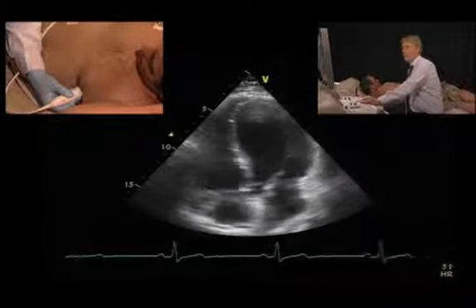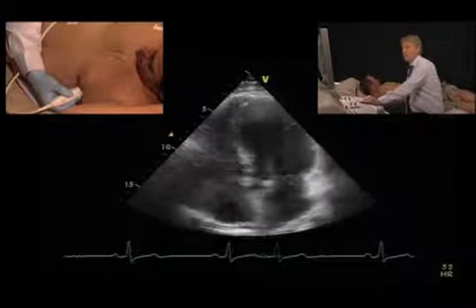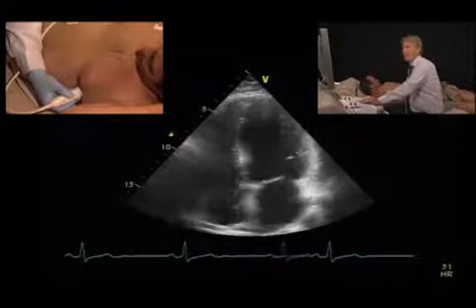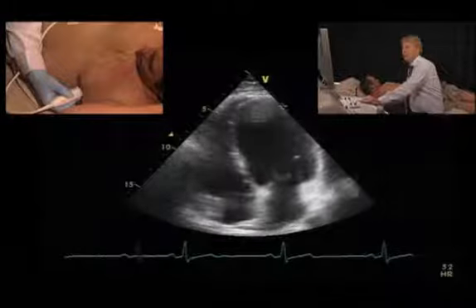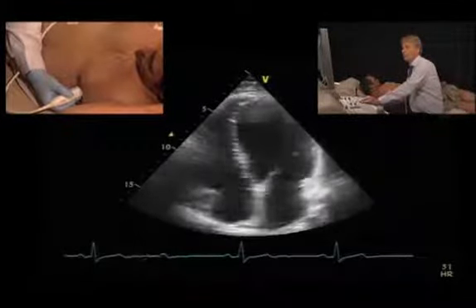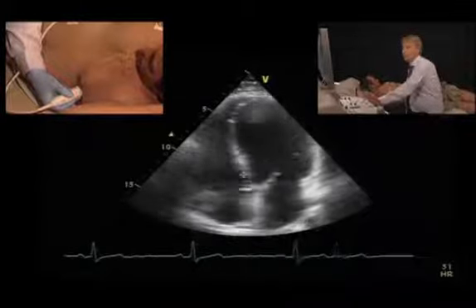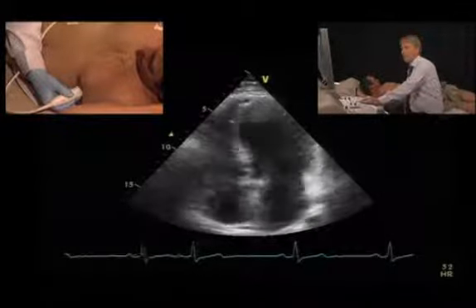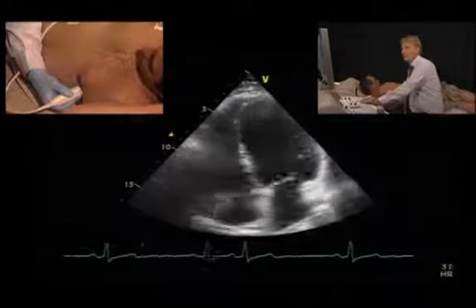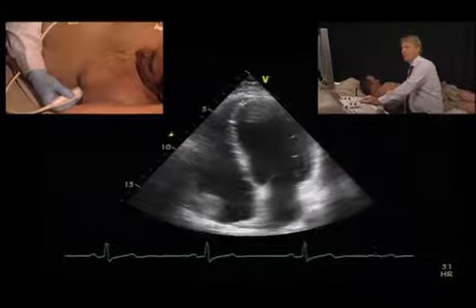And since this is the lateral wall and this is the septum, we can divide the following segments: basal lateral, mid lateral, and distal lateral, while this is the basal inferior septum or basal septum, which is usually cut in the region of the inferior septum, so it's the basal inferior septum, the mid septum, usually anterior, and the distal anterior septum.